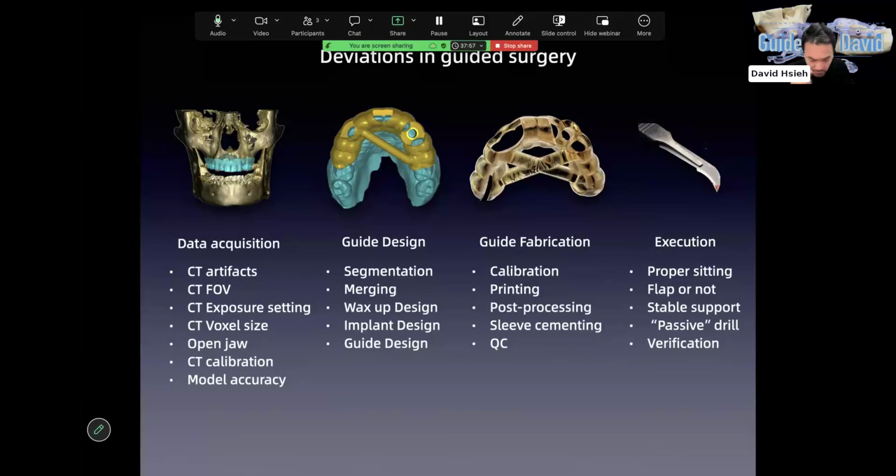I mean, we can do it very close, but it's almost impossible to get the exact mean accuracy right there. So we just need to respect all that, right?